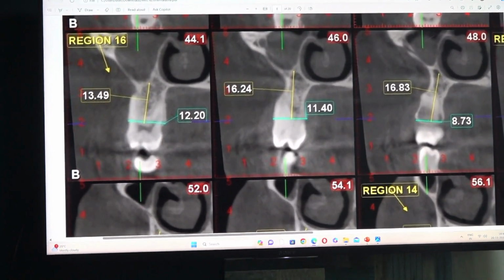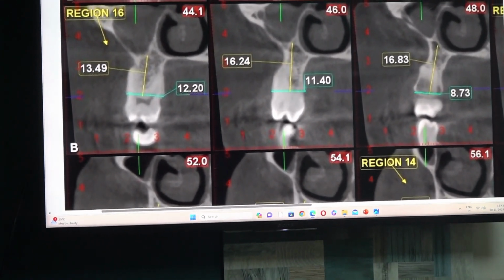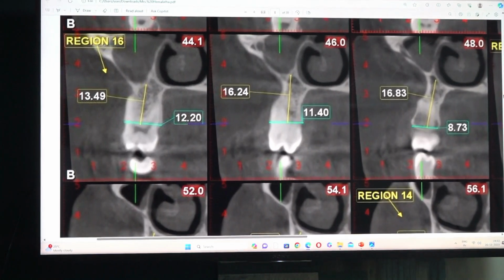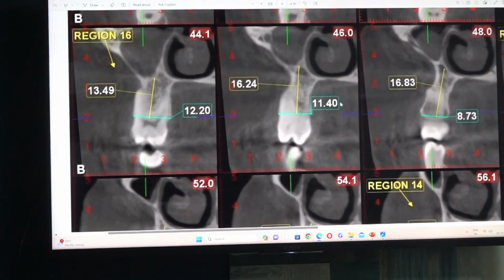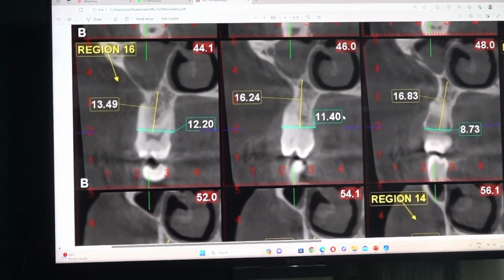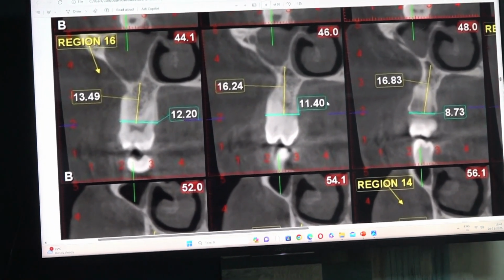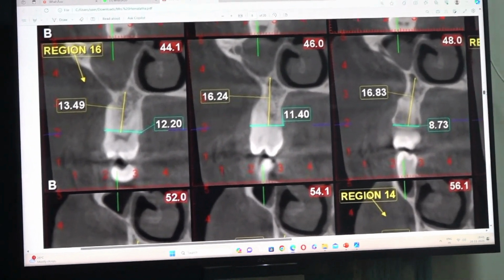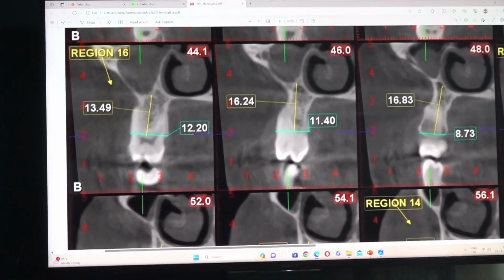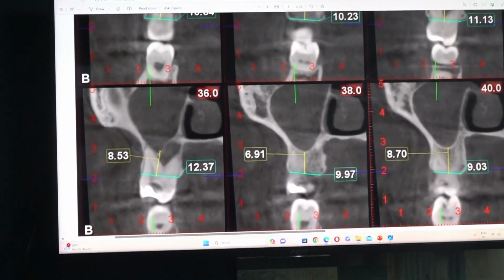Do not place implant in the mesiobuccal root. Palatal to the mesiobuccal root, start the drilling, you will get root bone. So palatal socket of 6 can be placed, but better avoid, because mesiobuccally you are placing one implant. If you place implant palatally, these two implants will hit each other. It's not a good idea. So we are going straight to the 7.